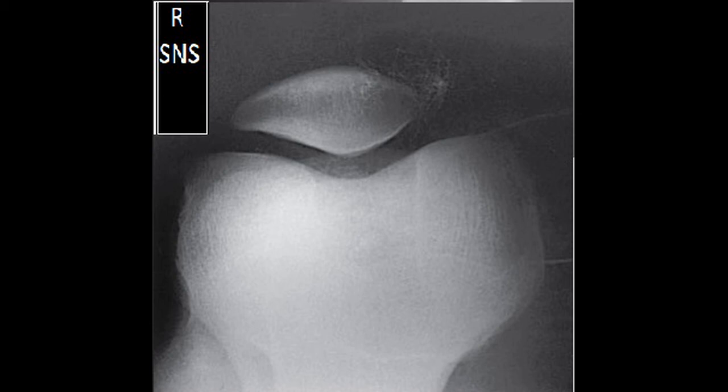This image was taken with my patient's knee flexed about 15 to 20 degrees. I didn't really have her flex it a whole bunch, and I did not get the collimator to 40 inches because that's really hard to do. It's a little bit more SID than Merrill's would like, but you know, it turned out great. Look at this beautiful image. So we are done, and thank you very much.